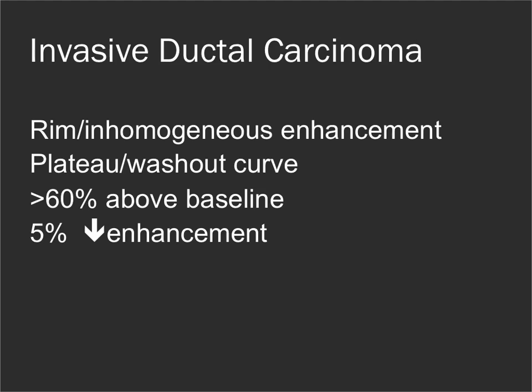It tends to have a plateau or washout type curve on the CAD, and that washout curve enhancement enhances to at least 60% above baseline and frequently more. However, about 5% of invasive ductal carcinomas have significantly less enhancement. And if the morphological features of the lesion concern you, then you shouldn't let the fact that it has a progressive enhancement pattern put you off.